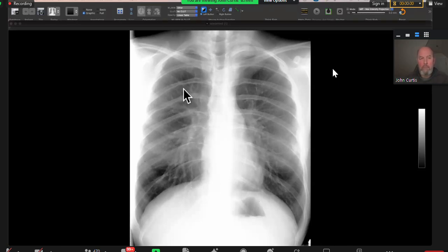Because the X-rays are passing through them directly, not along, I think, in the tangential view. Exactly. So it's more easily picked up en face. The French call it en face, whereas in profile you can see them there. So the appearances are those of neurofibromatosis. There's a neurofibroma there as well.